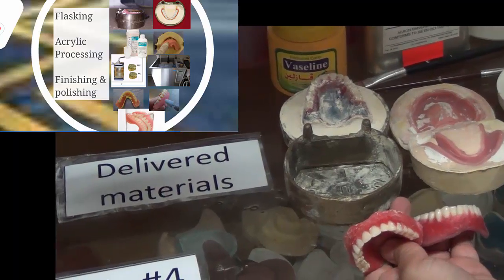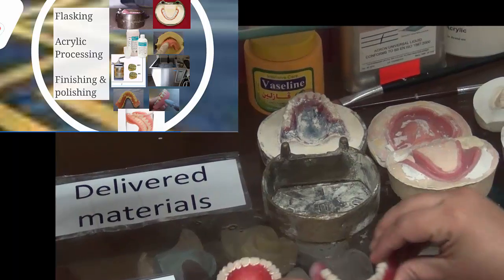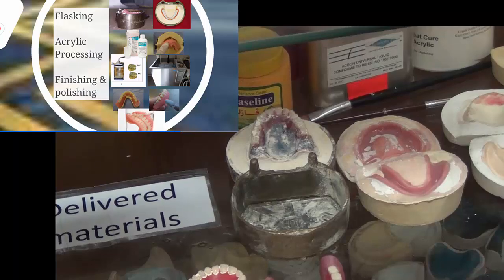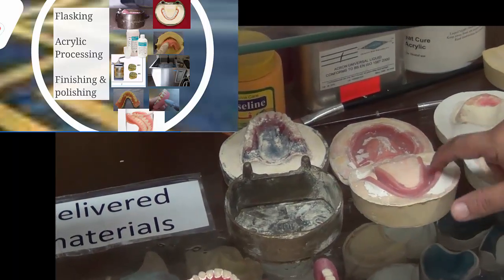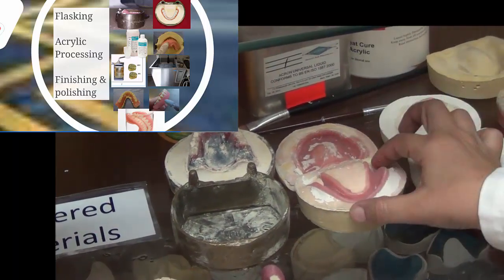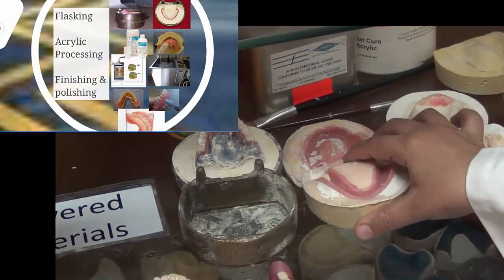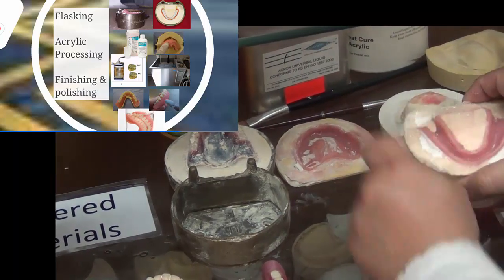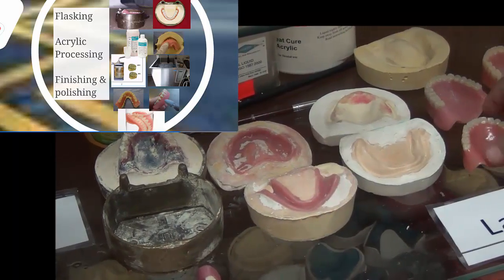So how do we change them? By putting them inside a flask. So these trial dentures, each one is put separately in a flask. Over the flask we add layers of stone. We remove the wax by melting it. And we replace it with a dough of acrylic inside. And once it is set, this goes to a heat bath, where it cures and becomes solid. Once they solidify, we fracture off the stone from around them, and we get dentures.